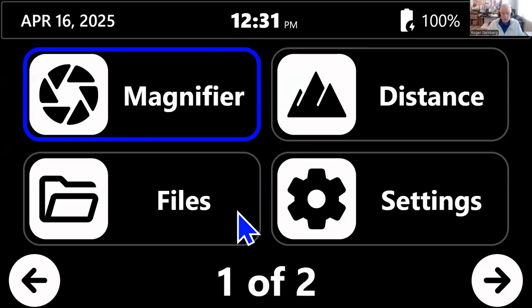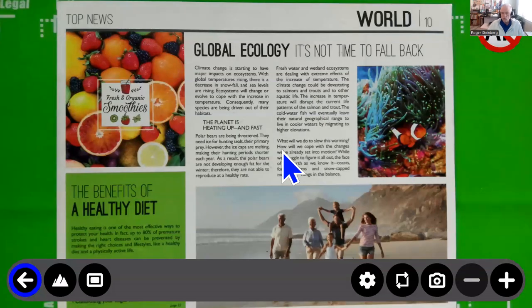You can also now see the contrast color that I applied, white text on a black background. So now my icons are down to black on white or white on black as appropriate, as opposed to full color. This way I get a really nice contrast when I look at each of my icons. I wanted to point out how that applied out here, and down at the bottom you can see it's applied throughout the interface. Again, the user can choose yellow on black, whatever combination they'd like to have.